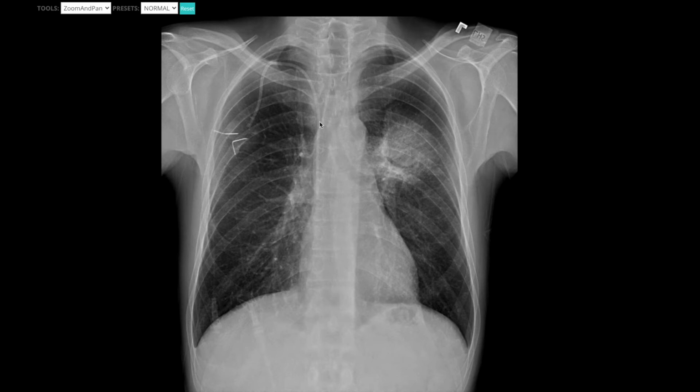The next thing you're going to go into is probably going to be the airways. Really with this, oftentimes what you're going to be looking for is if you have some type of endotracheal tube, or if you have some type of bowing of the trachea, whether it be because of some tension phenomenon or because there's some mass, like some type of anterior mediastinal mass that's pushing against it, that's going to cue you into something. But for the most part, you're not going to be getting all that much from the main airways here.